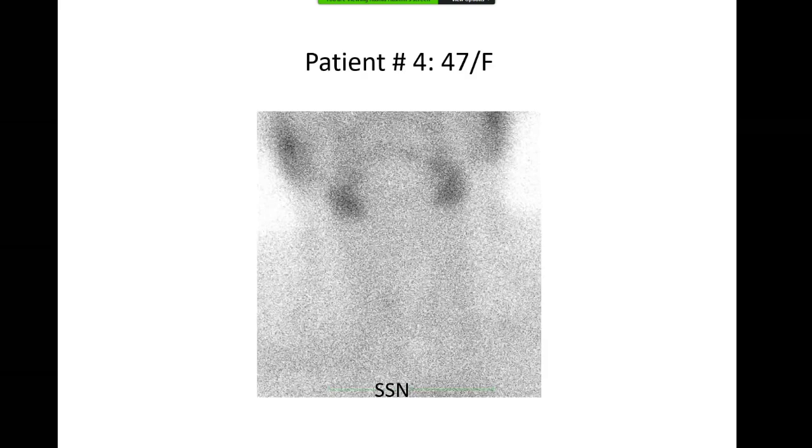Okay, so another patient who is also hyperthyroid. This is a thyroid scan of a 47-year-old female patient in which there is no radiotracer uptake in the region or expected location of the thyroid gland. No area of ectopic thyroid uptake is noted in the visualized film. So diffusely low uptake goes in favor of, keeping in view that the patient is also female, Hashimoto's thyroiditis. Yeah, good.